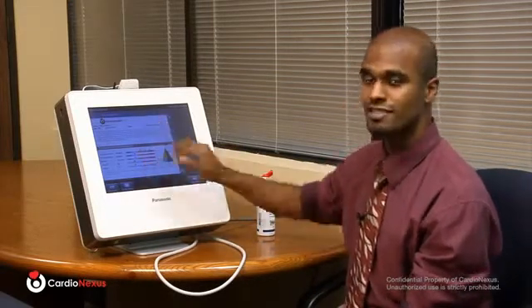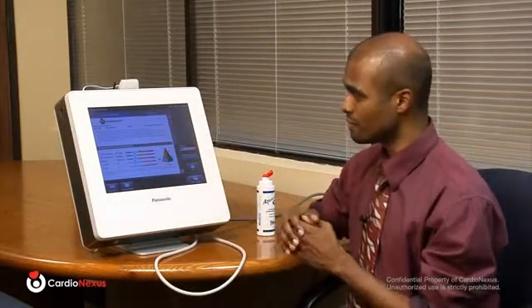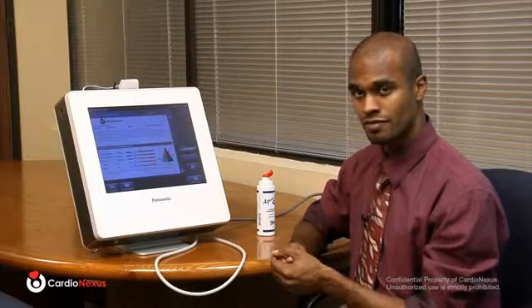Of course, it is stored as a record in the equipment as well. So briefly to describe the report, what you're presented with initially is the first page of the CardioHealth report. This is really aimed at the patient. So you have a brief paragraph here explaining in layman terms what was assessed. So we measured your carotid artery wall thickness. In addition to that, we calculated your Framingham risk based on traditional risk factors.